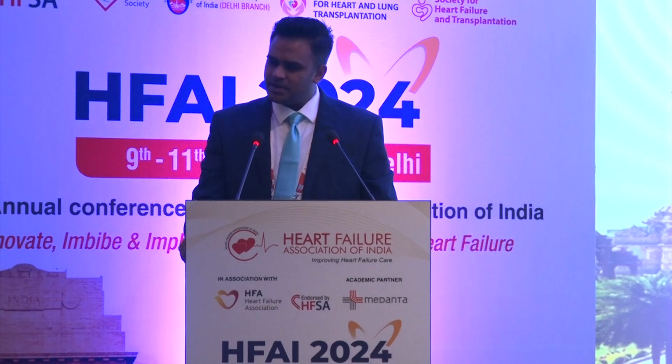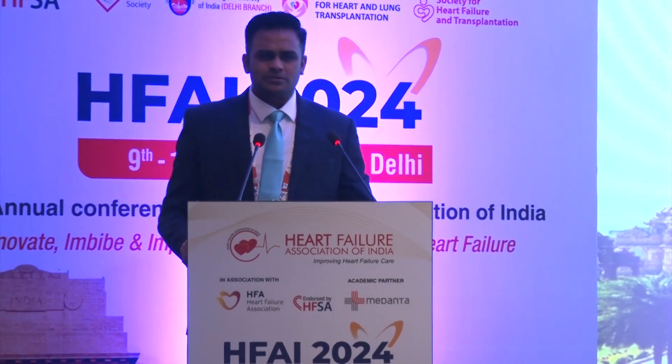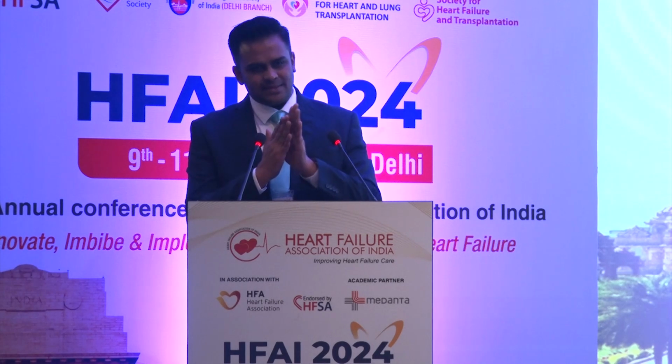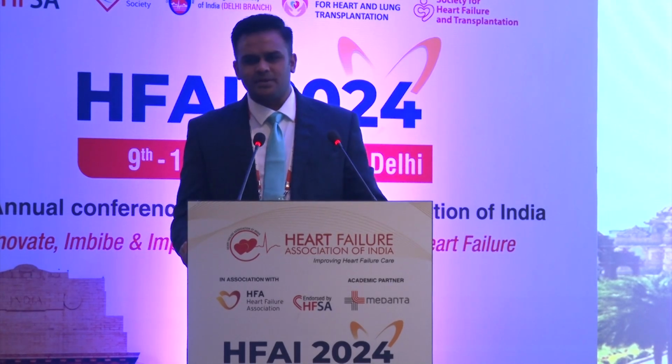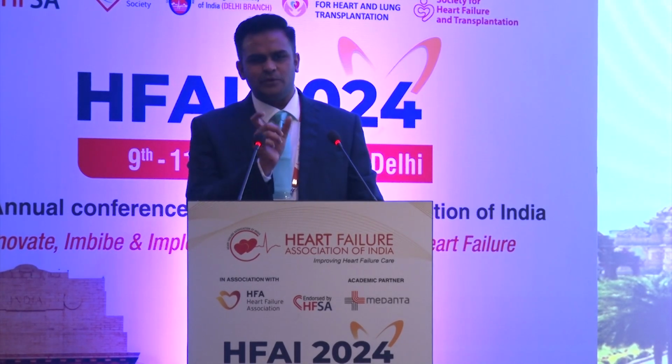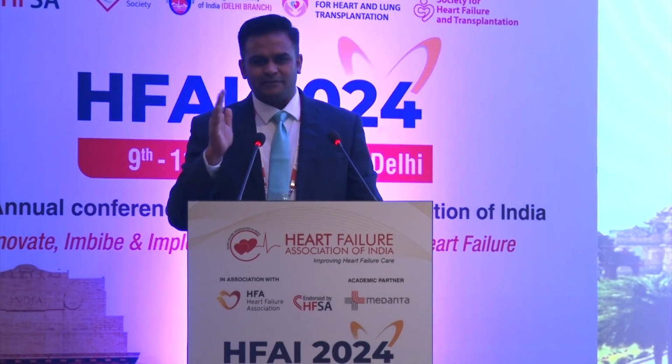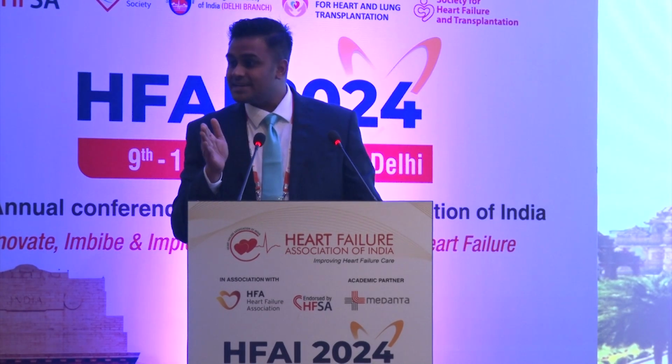Right atrial enlargement is still assessed by looking at the height of the RA and the rightward shift of the right heart border. We have a few objective criteria which I enumerated in my slides: 5.5 centimeter from the midline, or 3 centimeter.